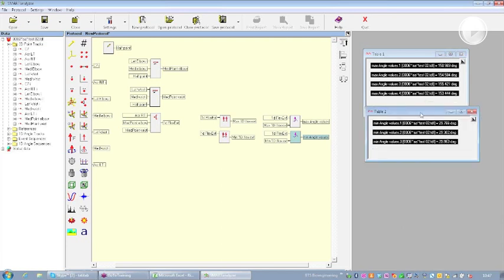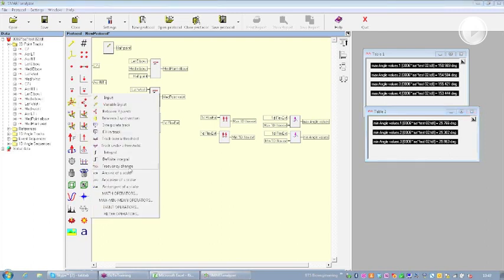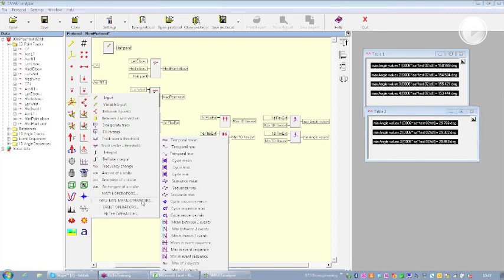Now I can define the average value of the maximum and the minimum, selecting the max min operator over a sequence.